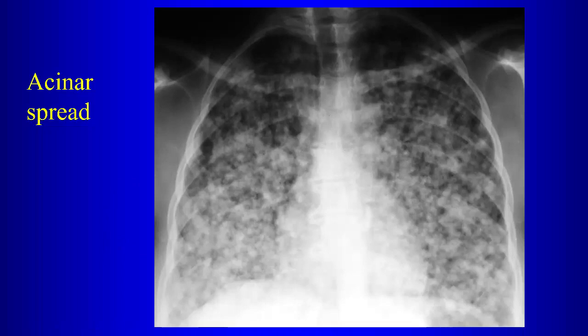You see an X-ray like this, what's the first thing on your differential? Miliary TB. Not miliary TB. No, miliary presents as what? It's tiny nodules, right? These are too big, okay? So what would be your first thought? Well, pneumonitis is a very nondescript term there. And not metastatic disease? No.